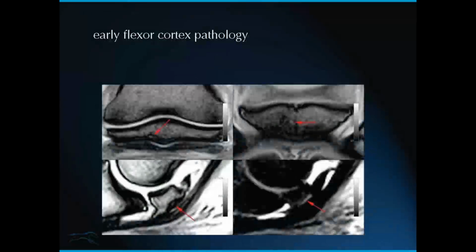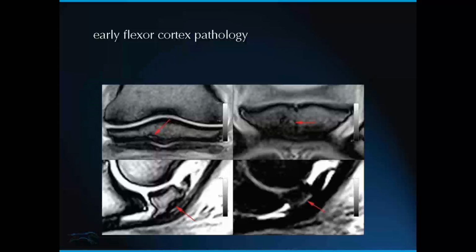The upright shot, and again I've said on MRI we can't appreciate foot balance, so this is still very, very important in your radiographic set. When we're trying to get nice, very symmetric sequences on MRI, these sorts of capsular distortions can often make it quite difficult to get nice images, but it's very important that we get this type of image to appreciate that and what may or may not be going on inside.